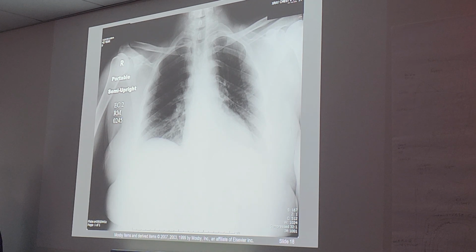What else? Do we have any rotation? Yes, the clavicles look long. The left side looks long. On the right side, I could see some space between the clavicle and the spine, but on the left side it's very close. So there's some rotation going on. Okay.